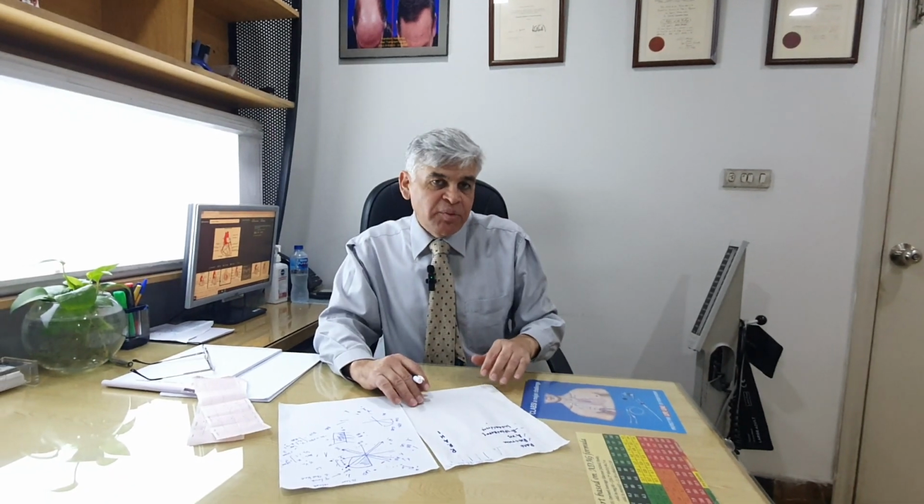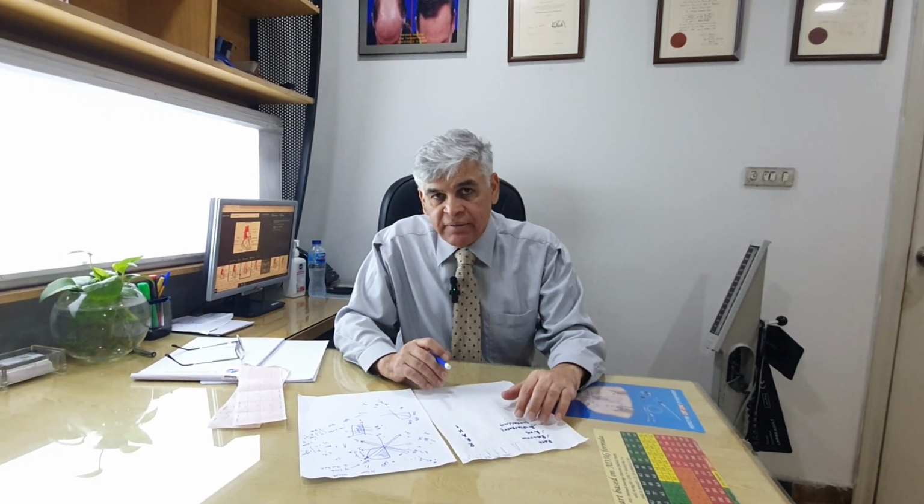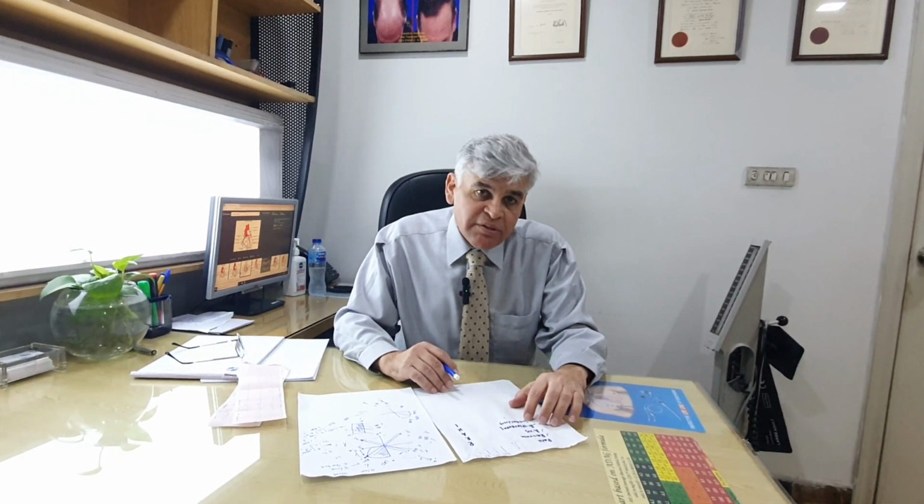The last in the series of interpretation of an ECG is ischemia or infarctions. We've covered rate, rhythm, axis, and hypertrophy. Infarction is the extreme of ischemia. So in an ECG, you can find out about ongoing angina, as we call it clinically. That means ischemia of the heart, and likewise infarction as well. The waves to look out for are the T waves and the QRS complex.